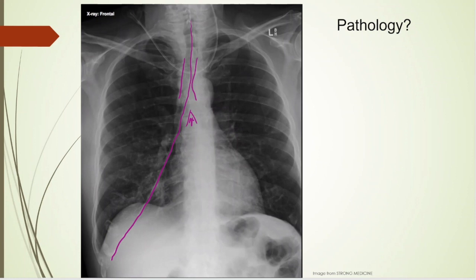So let's go on. B for bones. Check the ribs, clavicles, vertebrae, etc. All look fine. C for cardiac silhouette. The patient's right, a little difficult to see here. You can see the ribs clearly. So he may have a little consolidation going on over here as well, because you can't really pick out the cardiac silhouette.